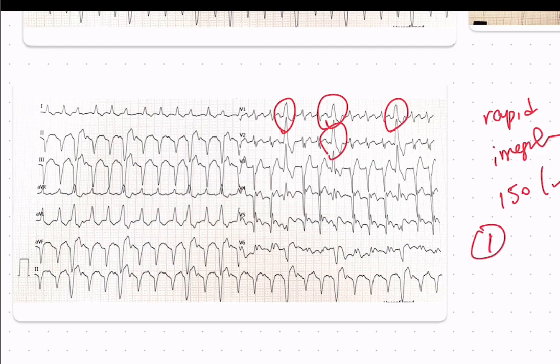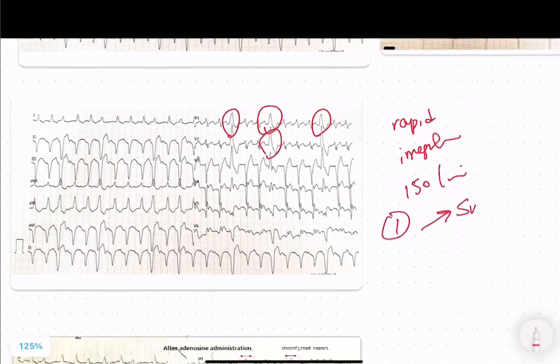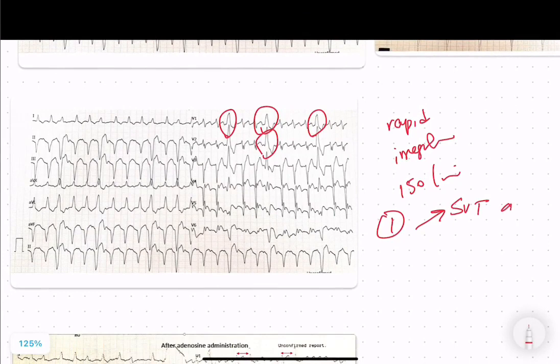One, what exactly is the diagnosis of the arrhythmia? Is it supraventricular tachycardia with aberrant conduction, or could it be a ventricular tachycardia? Two, what about these single wide complexes with different morphologies in between? To address the first question, let's consider the patient's history of heart failure, which guides us to ventricular tachycardia.